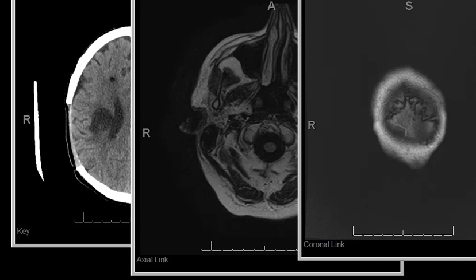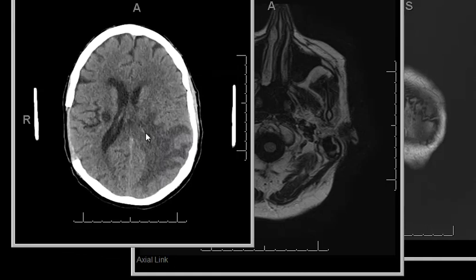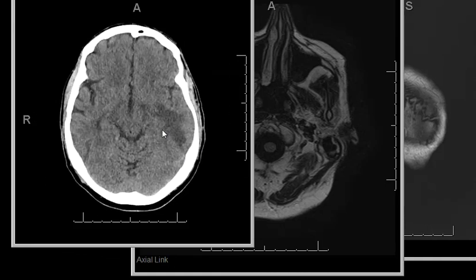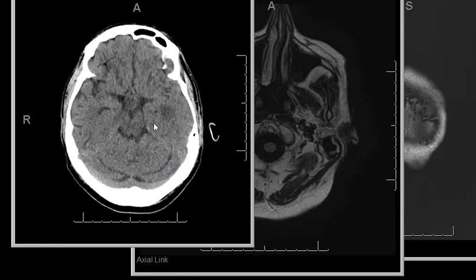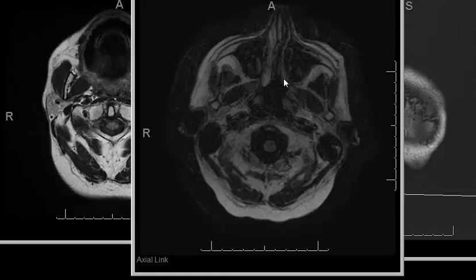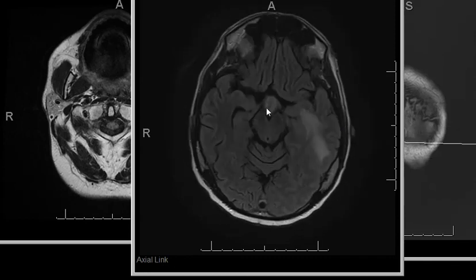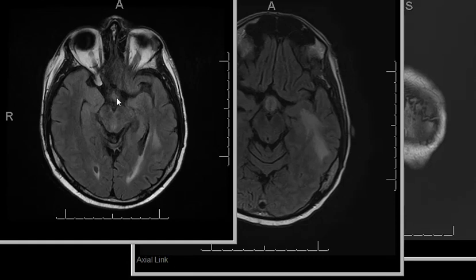A change of topic. Another interesting case: a young patient, 40-some years old, with a history of left parietal mass and metastasis. We measured the mass, everything, no problem, except that we missed something in this picture on March 11th. This is an MRI follow-up on March 12, 2018. We missed a lesion here that was not seen there.